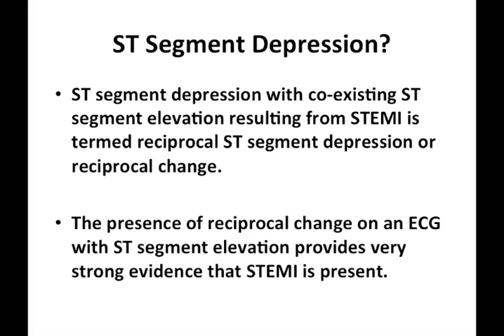So ST segment depression with coexisting ST elevation on other leads of the same ECG is termed reciprocal ST depression or reciprocal change. Why is this important to note? The presence of reciprocal change on an ECG provides very strong evidence that STEMI is in fact present. In other words, it helps you rule in STEMI in some of the more difficult cases.